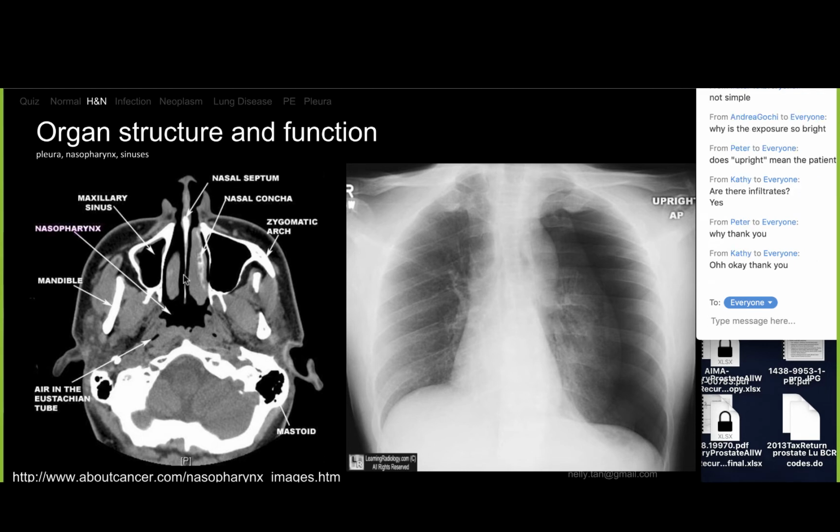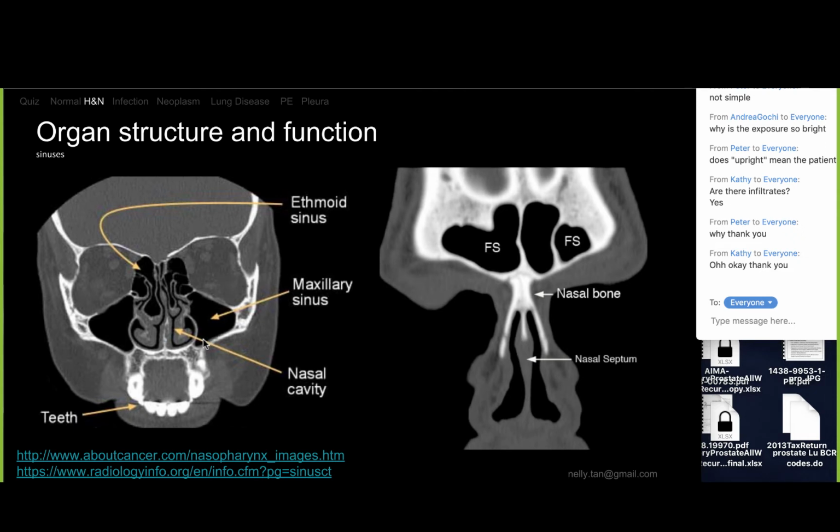Good. Next. Okay, so more sinuses. So we said this is the maxillary sinus. Up here, up high is the ethmoid sinus, and this is what part? That communicates into the intracranial region. This bone is called the cribriform plate, where the olfactory neurons are. That's perforated. Good. This is probably why when you eat wasabi, it goes straight up into your sinuses. So good. That's the ethmoid sinuses.